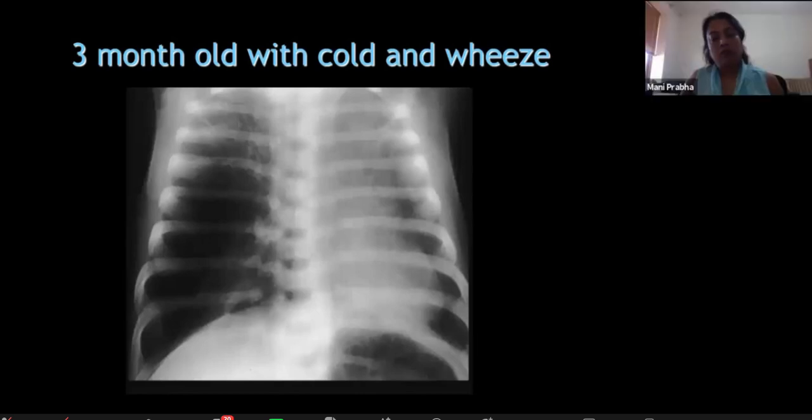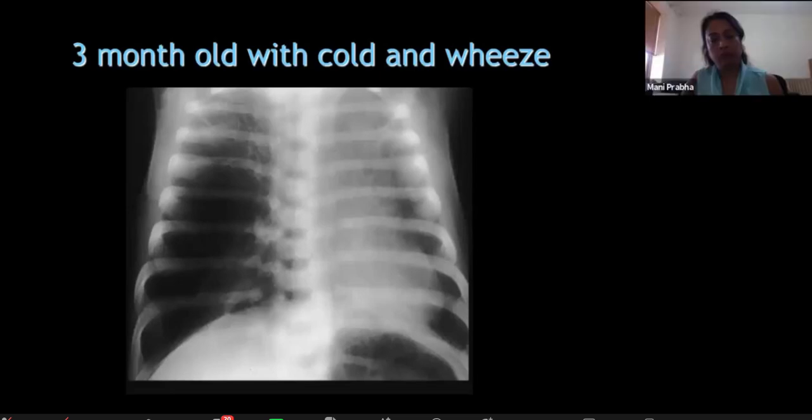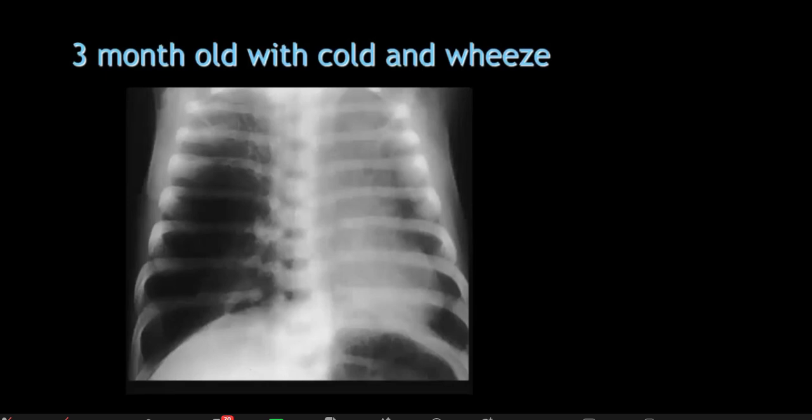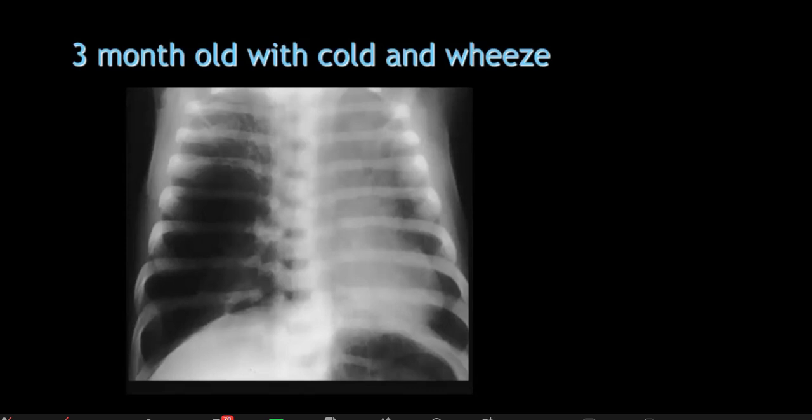I can see the trachea as well, but my differentials for a hyperlucent thorax in a 3-month-old, I'd include Swyer-James in my differential. Because I can see some lung tissue in the right lower lobe, this could also represent a pneumothorax, which is causing a contralateral shift. It's too small to have a bullous emphysema. So these would be my 3 differentials.